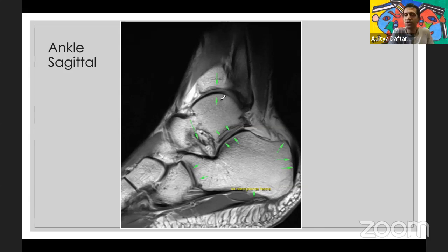This is important when you start to make decisions regarding whether you're going to do a single, dual, or triple arthrodesis. The posterior superior aspect of the calcaneum is important to look at in patients who might have a Haglund deformity, and then look at the insertion of the Achilles tendon on the calcaneum. We'll talk about that later.